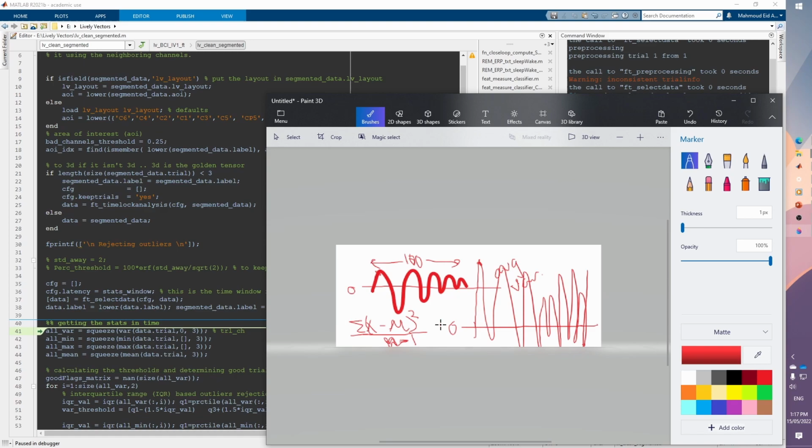And when we check the minimum and the maximum, we will have a rough idea about the minimum and maximum that normally happen in our data, and what kind of minimum and maximum are really huge or very small, such that they should be outliers.